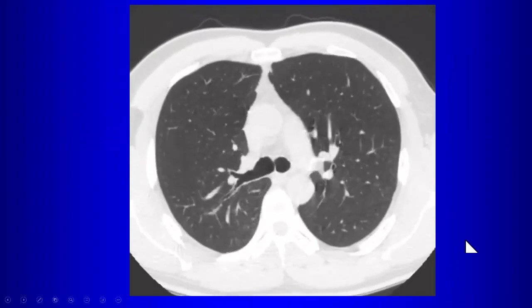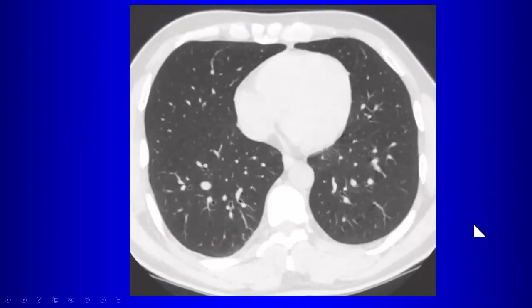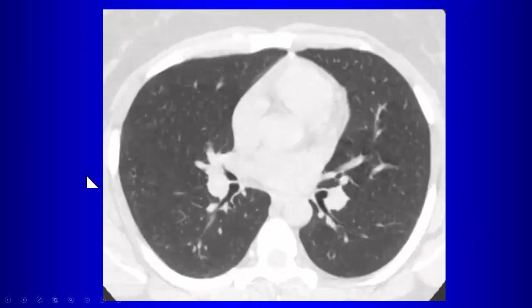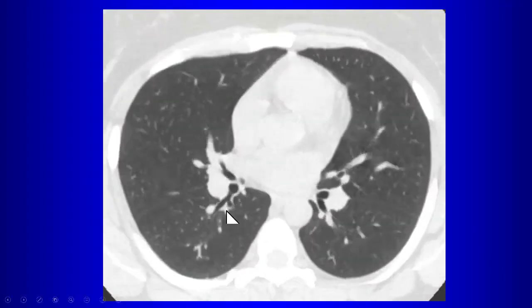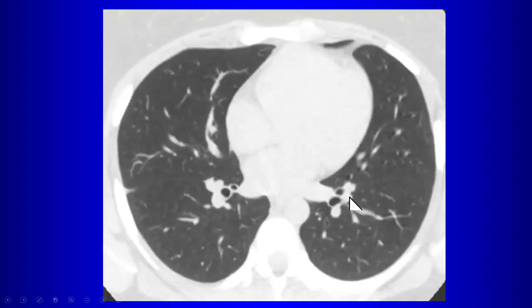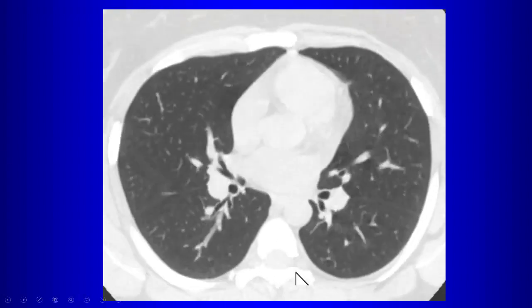Again, it's important to practice this, go through an axial CT scan, try to name all these segmental airways. That's basic stuff that you should know at this point on the chest rotation, or just in general. Here's a nice example: medial, anterior, lateral, posterior there on the right side. Anteromedial here, lateral, and posterior on the left. And medial, anterior, and then here as we come down, lateral and posterior.